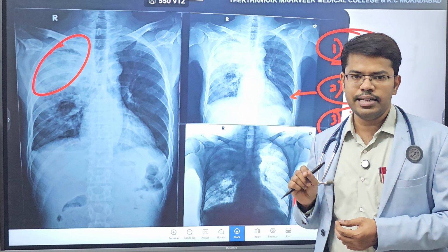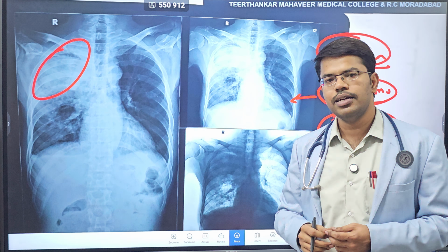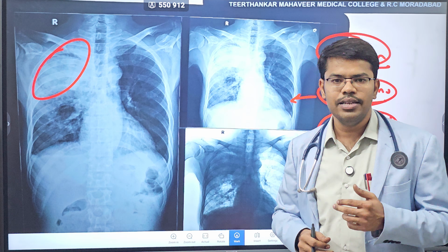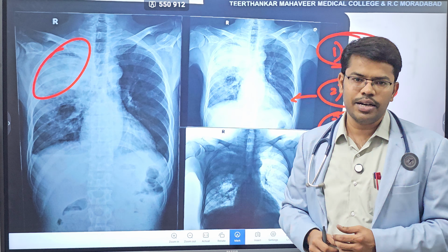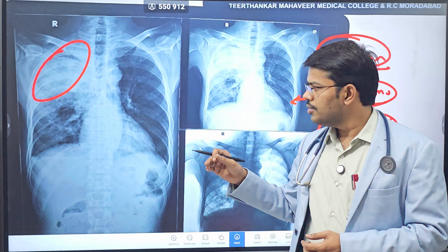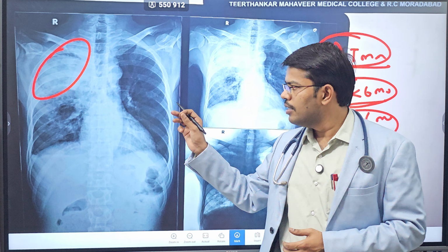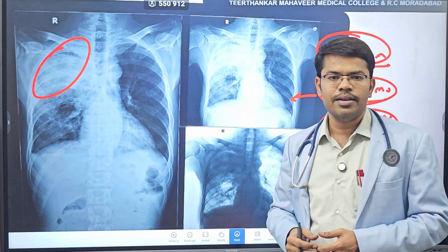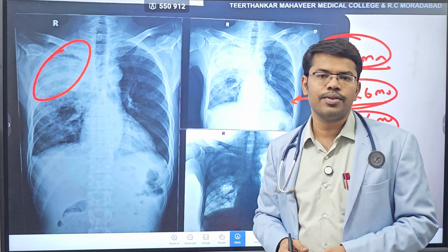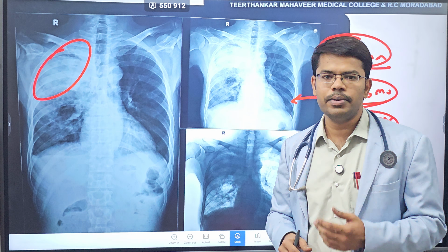What is the typical finding? Here you will get this kind of infiltrates, lobar pneumonia. Suppose it is not responding to drugs, you have to check the immunosuppression level and reduce it, and you have to look for fungal or other organism etiology like viral and fungal. So the patient responds to the antibiotics, as in this case the infiltrates became milder and normalized. Suppose the patient is not responding, then what other option is there? We have to proceed with CT followed by BAL if required to find the particular organism.